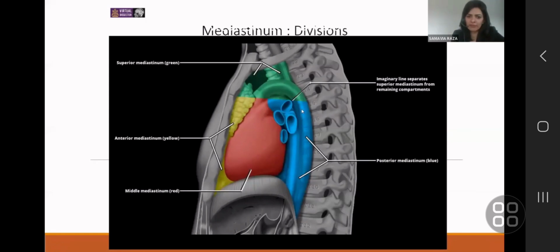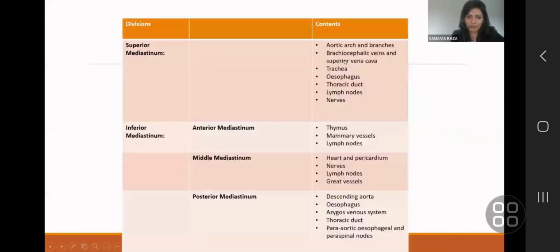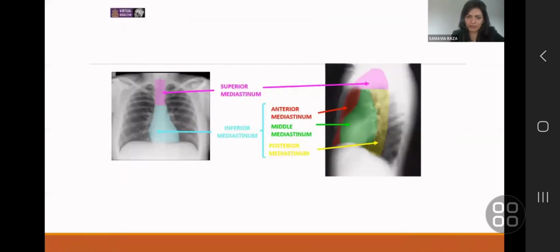So that's the lateral division of the mediastinum. You can roughly do that division on a frontal radiograph as well. Can you accurately count down to T4 on a frontal radiograph? You can more easily than on the lateral, because you can see the first rib. You follow the first rib all the way back. That's T1. Go lower down and make that distinction like that.